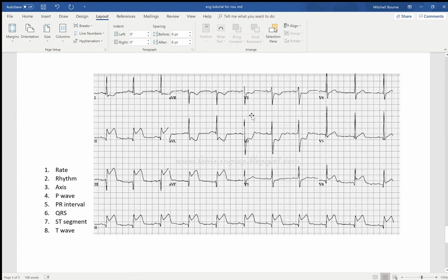our lecture tomorrow on ischemic changes. So hopefully something stands out to you about what is wrong with this. You don't have to know exactly what it is, but something is very bad with this EKG. Hopefully it at least stands out to you that it looks weird.